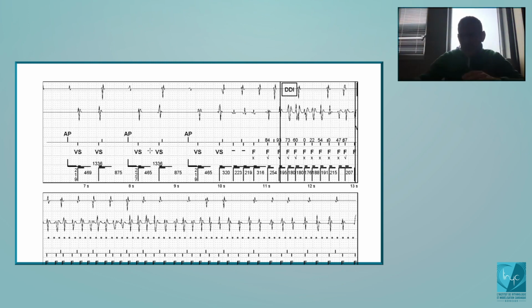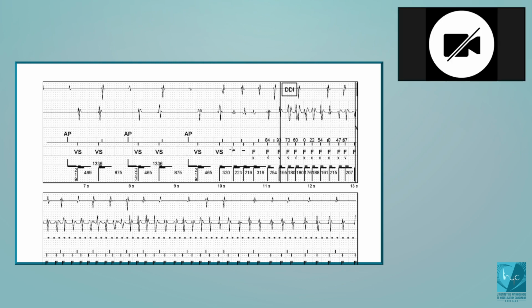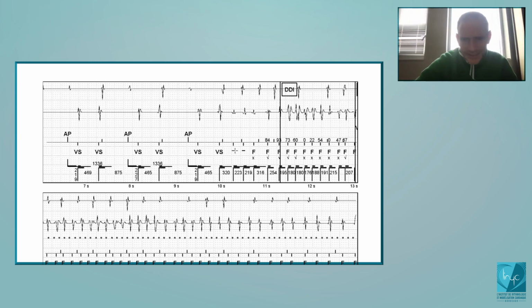So what does it mean, this cycle? It means that it's in transition. It means that this cycle is different from the mean value of the last four cycles. Maybe it's faster than the mean value. Exactly. This is a major difference compared to all the other manufacturers. In all the others, a cycle is classified according to the current interval. That's true for Medtronic, Biotronik, MicroPort, or Boston.